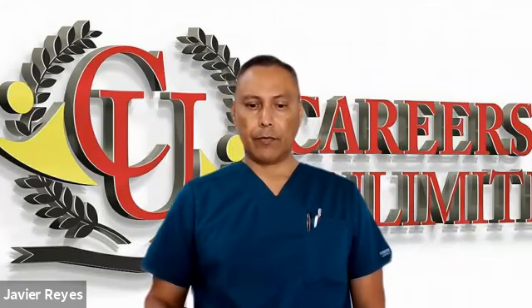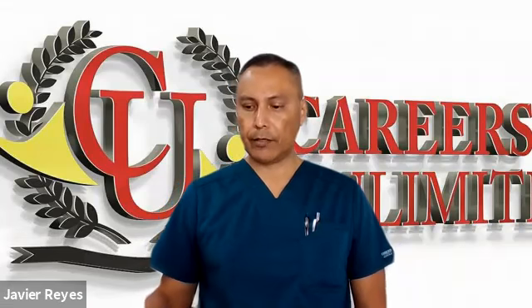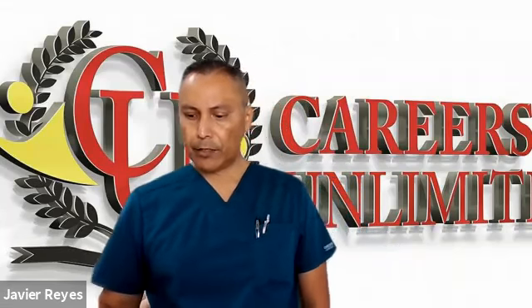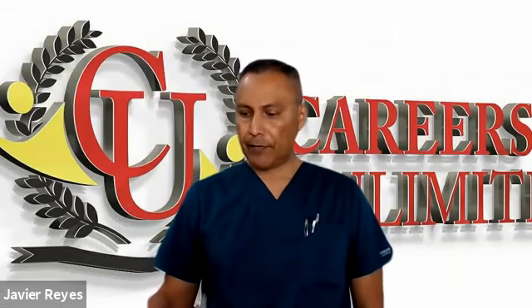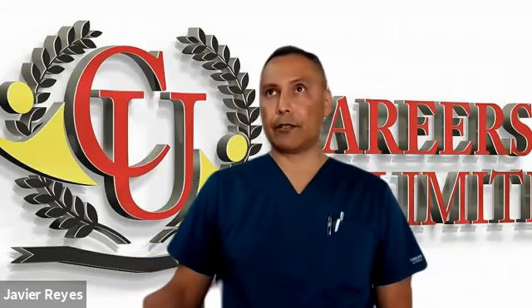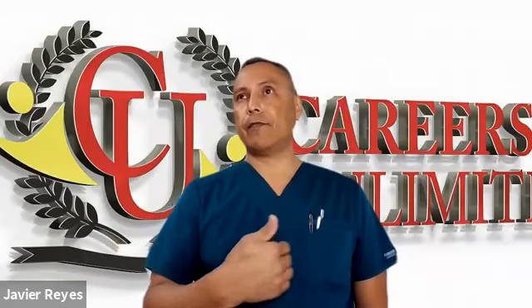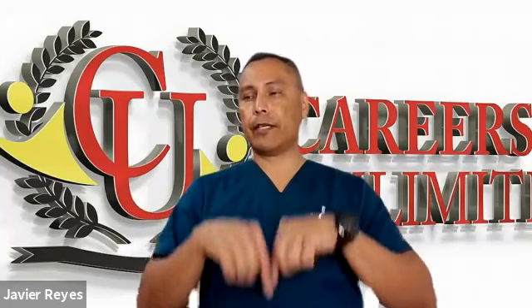Okay, so with that, let's continue to look at the differences between the left and right bundle branches on section 10.2. When monitoring leads 1, 2, and 3, the characteristics of LBB and RBB will be the same. Specific characteristics of the right or left bundle branch will present when monitoring on leads V1 through 6. Why? Because the bundle branches run down the septum, which is the one that divides the left and the right ventricle. So the tissue of the bundle branches runs right down through it.